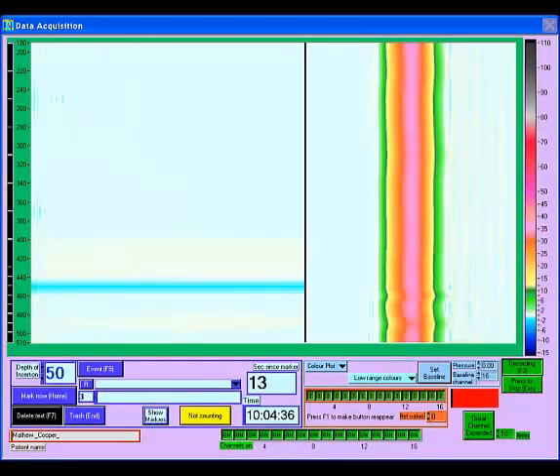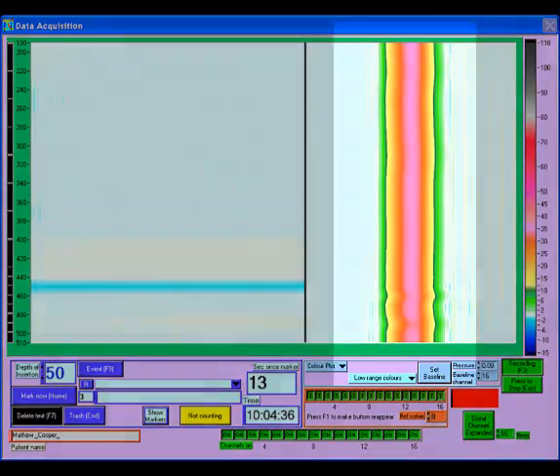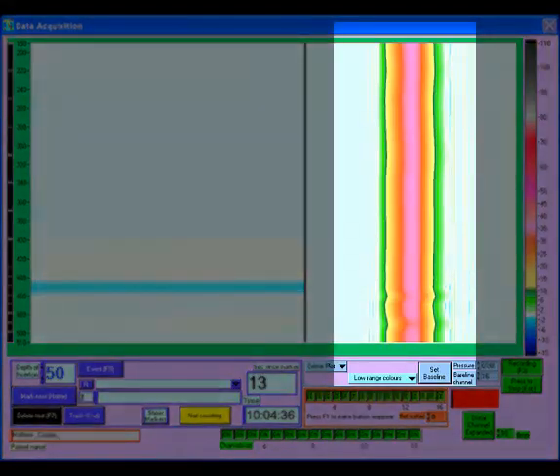You can check that all of the channels of the catheter are perfusing and that the calibration is correct by lifting the bowl up 50 centimetres or so. This should induce a pressure rise of equal proportions, that is, the same colours, up to about 40 millimetres of mercury in all of the channels. If one channel is not perfusing or is incorrectly calibrated, it will not change colour with the rest.